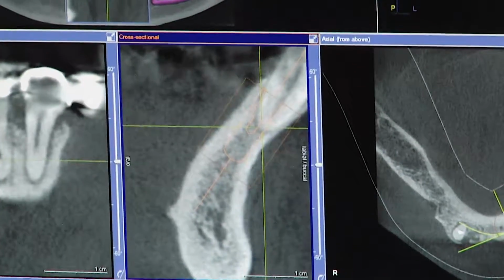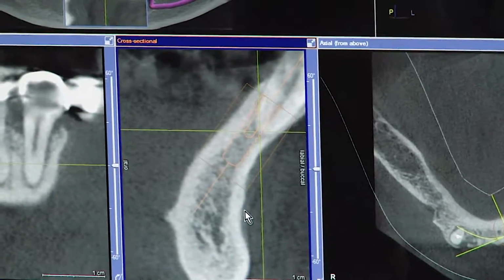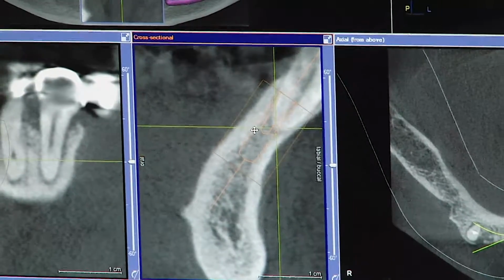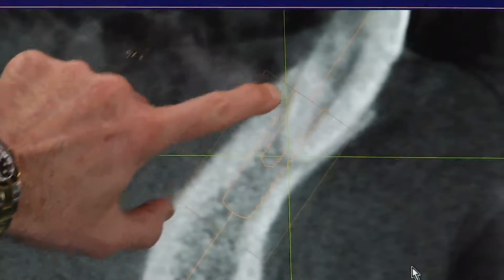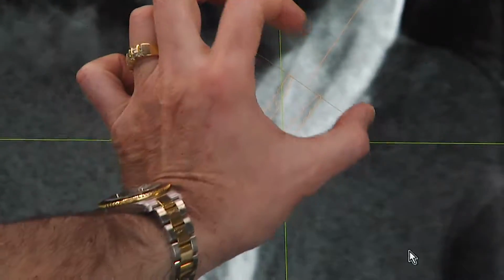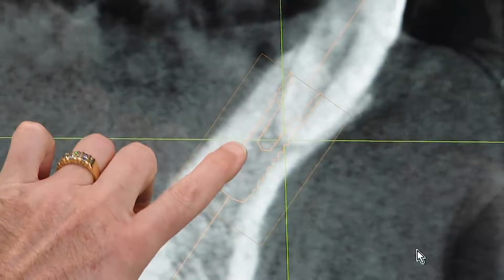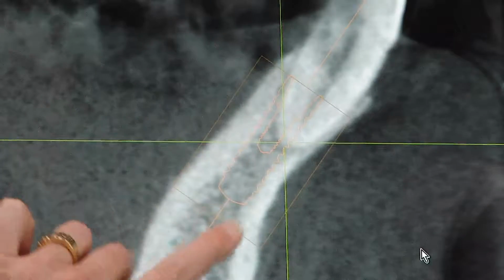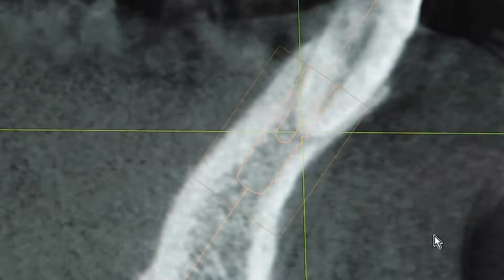And I think I'm going to use a slightly narrower implant. Are you able to pick that up well? So that you can see how that implant is fitting into the jawbone here. So here's my implant, and here's the bone that we're going to be putting it into. By using this size of implant, I have lots of bone on both sides of where my implant's going to go, and I can visualize exactly its positioning, and then we can go ahead and place that implant.